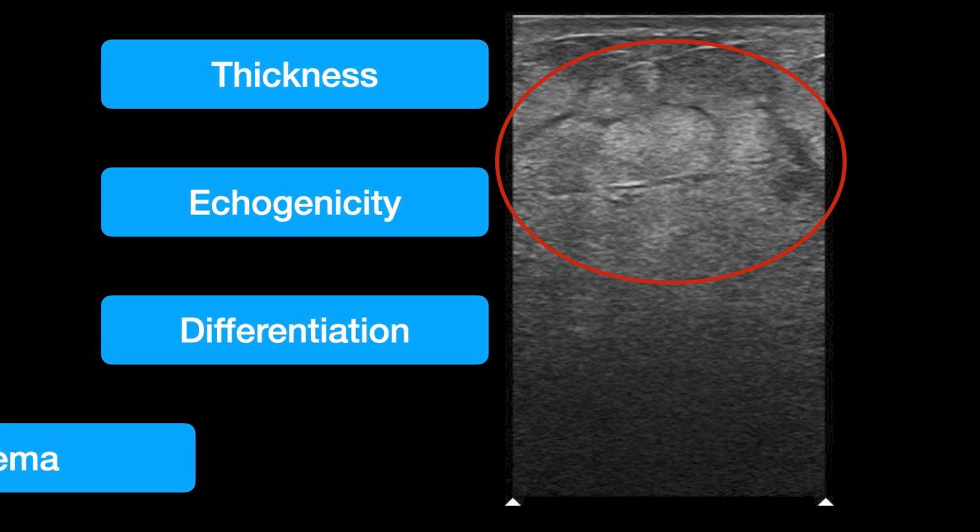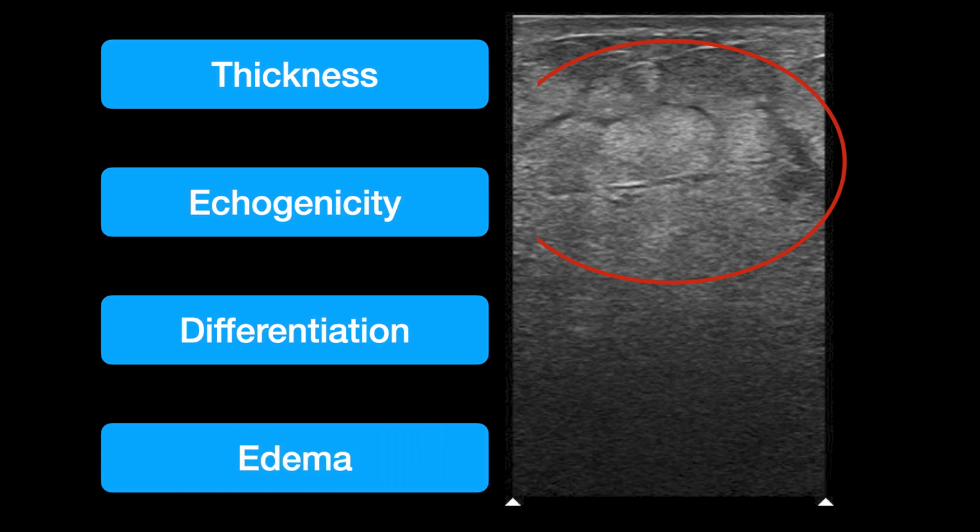And the final thing that we're going to see, the fourth characteristic of cellulitis on the ultrasound, is going to be edema in the tissues, right? And so this is where, when I showed that picture of the river through the forest a couple slides ago with those 5 different characteristics of inflammation, this is what I'm referring to, right?